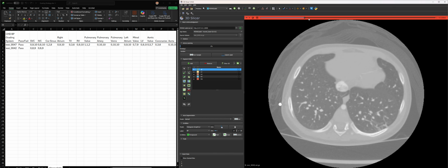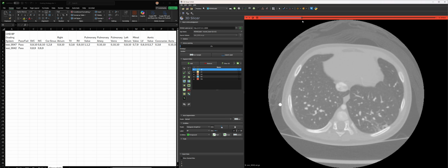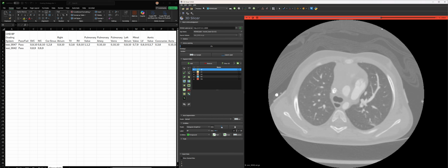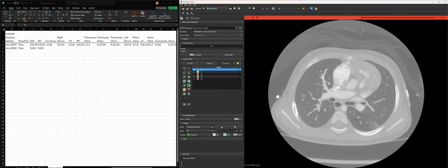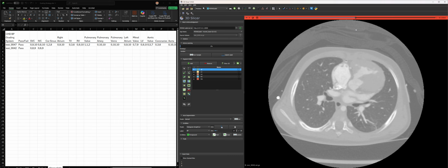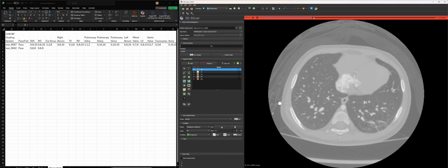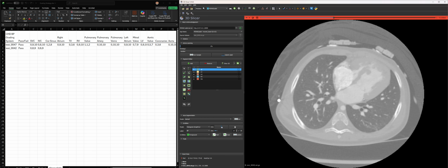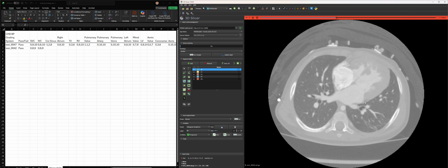So again, it comes in on the bottom of the right atrium, so right below the left atrium. So as I go to the bottom of the left atrium, the coronary sinus drains the coronary arteries, so I have good contrast in the coronary arteries. And if I have good contrast in the coronary arteries, there's a good chance I should have contrast in the coronary sinus. Maybe right here, I'm going to go like, this is a fail. That's actually the artery.